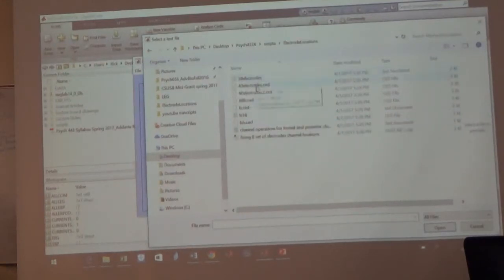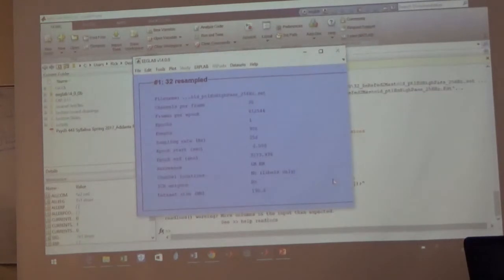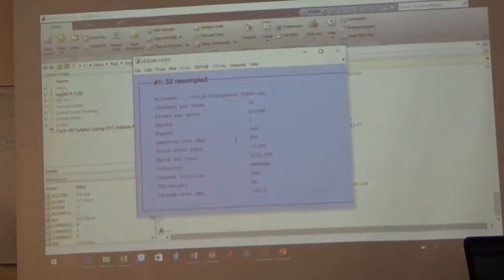You went under edit and then you went to... Sorry? Oh, okay. I'm just catching up to you guys. Oh, no, you don't. Go to file? No, edit, sorry.